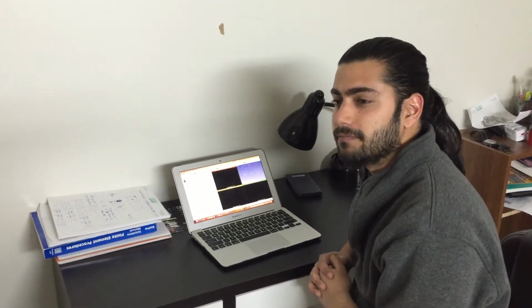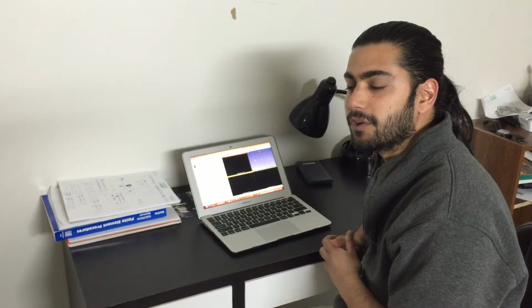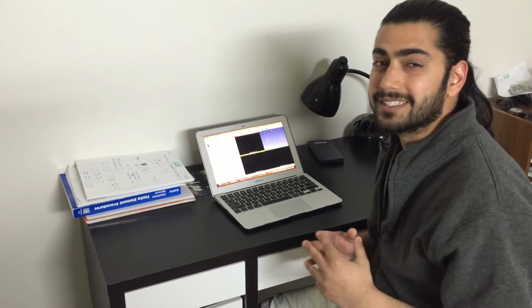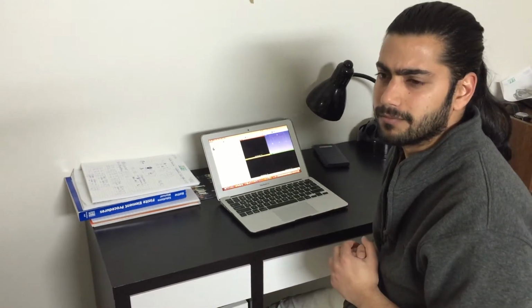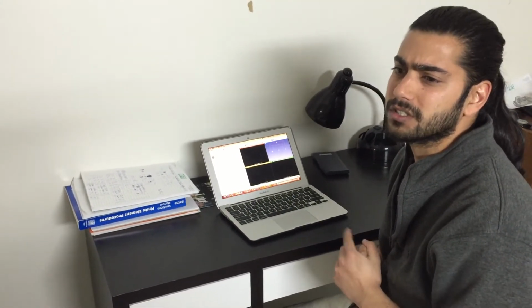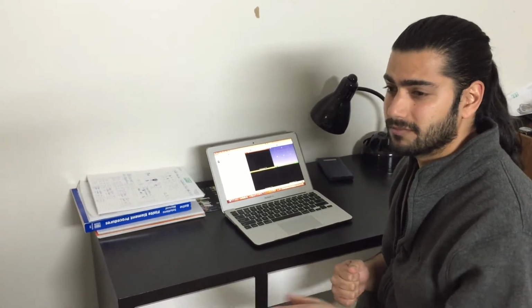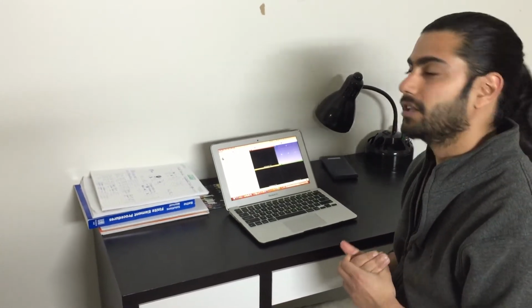My name is Jas, and we did talk about the Arduino interface with MATLAB last time. This time we are talking about our third assignment, which is how to use 3D Slicer to segment out a particular area of interest, for example from an MRI image or CT scan image. If you want to segment out an area where the patient might have cancer or anything, for more case study, and create a 3D model of that particular area, we can do that using 3D Slicer.